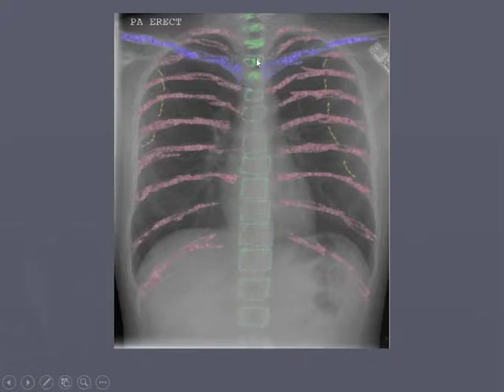It's not crooked going like this. It's not crooked going like this. The head on the right one isn't over here, where the head on the left one is over there, meaning that they're off center. This is looking right at you.